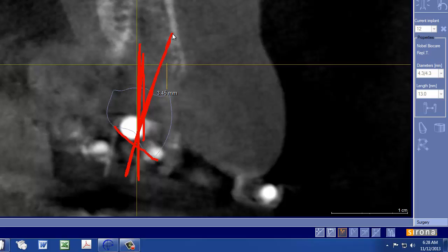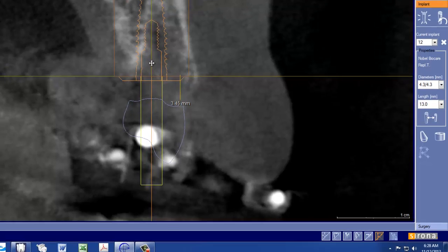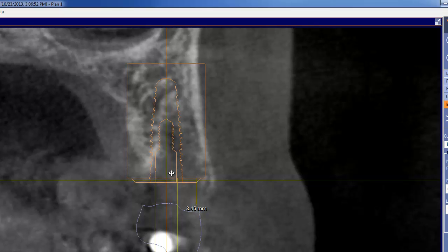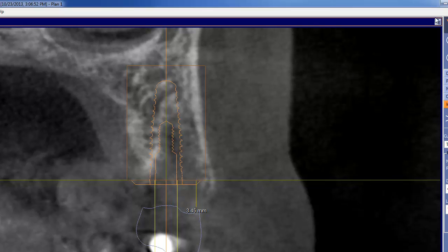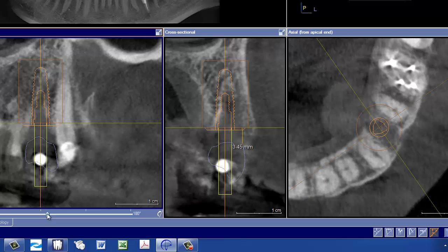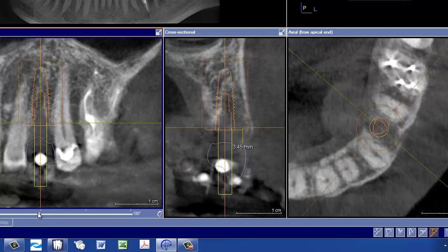So again, I prefer to take a little extra time and make sure that my CEREC drawing is correct, okay? Let's go ahead and get back now to the implant planning stage of this. So I'd like to see our implant plan to be somewhere probably at this level right here from a planning perspective. And again, if we take a look, it's going to look deep interproximally because the interproximal bone does go up. And then we can go through our planning checklist and go mesiodistal, buccolingual, all those things.